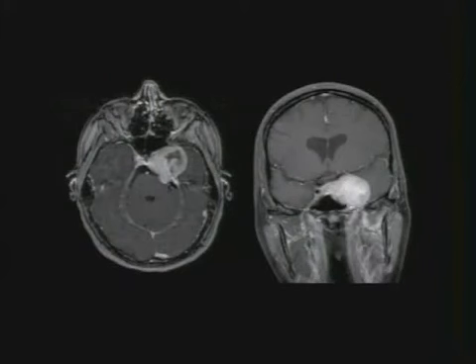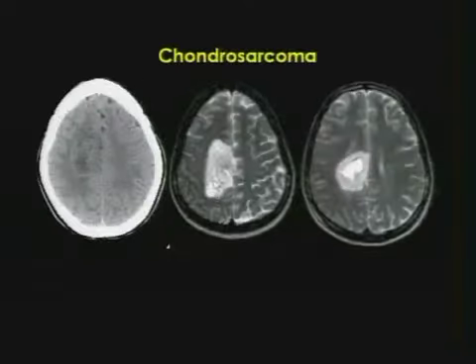Here's another example of a hemangiopericytoma. When you see this focal area of necrosis in an extraaxial tumor, it's very rare. This patient happens to be status post embolization, and that's why it looks like that there. This is the type of tumor that you may or may not see in your career. I've seen 3 so far, so maybe it's not that unusual. Here's a lesion. You can literally cut it out with a scissor. No degree of edema. This tumor's been growing there for a while.